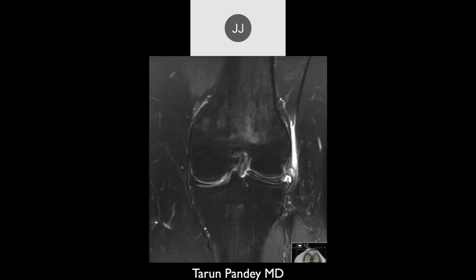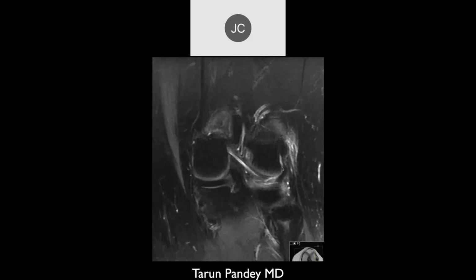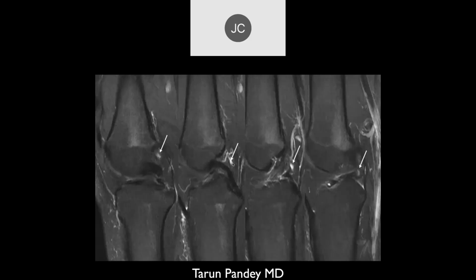Okay. So here we have another discoid meniscus with a horizontal tear with a parameniscal cyst. Right. And most of these with a parameniscal cyst are going to have a complete tear somewhere. So almost all these tears are true tears rather than just intrasubstance. And you can see that a little bit of the signal here actually goes along Wrisberg's ligament as well, posteriorly here.